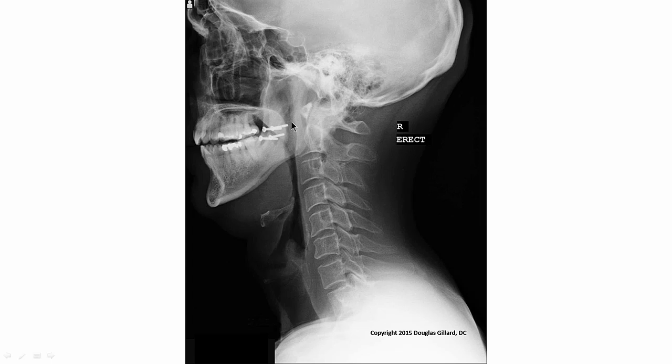Nasopharynx, or pharynx, however you want to say it, goes to about here, about to the uvula, and this region right here would be the oral pharynx. There's a laryngeal pharynx as well, but kind of neat to see. Vocal folds would be right here, or vocal cords. Okay, I'm digressing. Let's stay on point. Articular pillars are right here. This is tagged right here. Superior articular process of, got to count them, 2, 3, 4, 5, 6. Superior articular process of 6. Spinous process of 6.